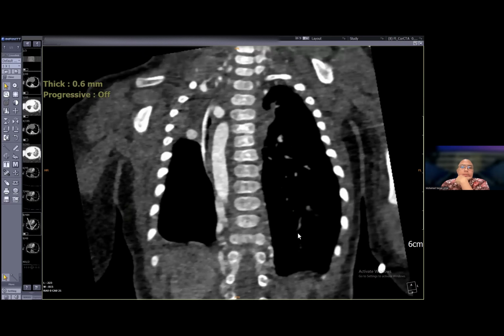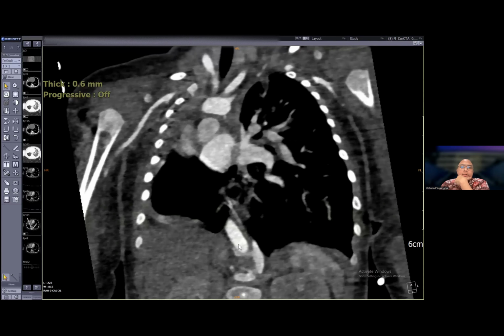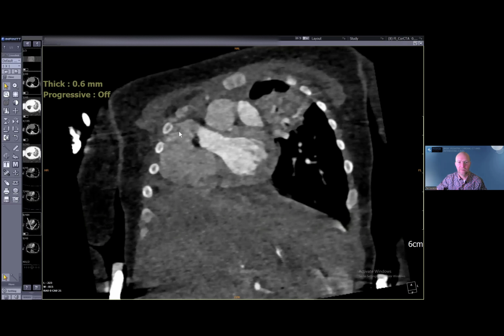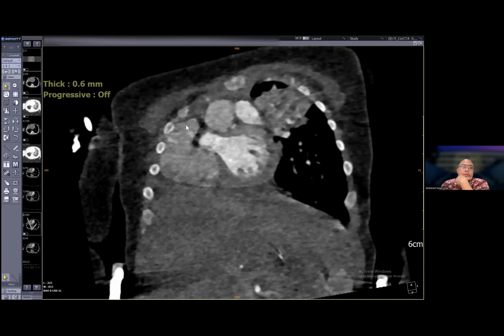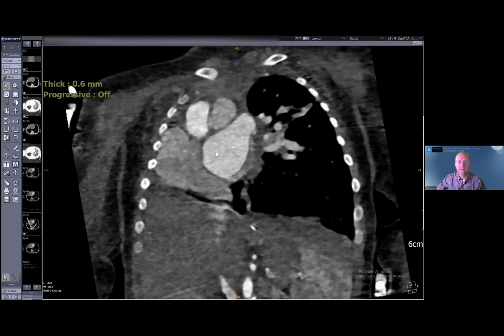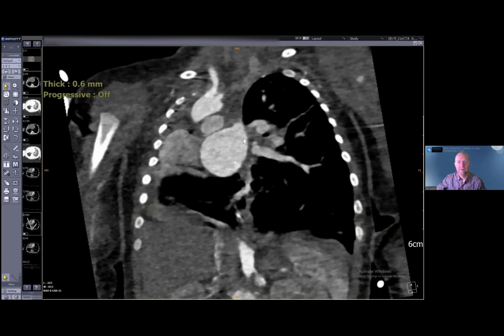This one. There's also dilation of the azygos vein in here. Oh, I see. So that very hyperdense thing on the right side was just a dilated right atrium and the right atrial appendage that I was looking at. Yeah, that's the right atrium. Above it, you have a little bit of thymus, I guess. Okay. Yeah, indeed.